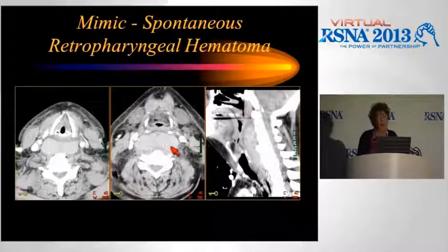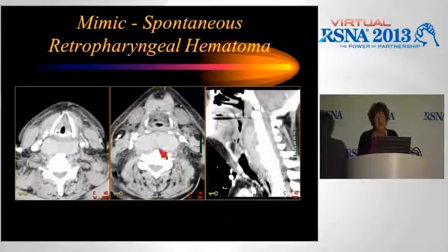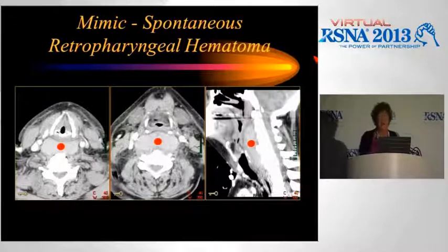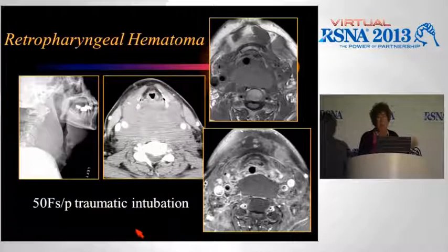Now, I don't know what the cause of this one was, but it's clearly visible here on CT, and I'm thinking it might have been related to the significant anterior osteophytes of the cervical spine. I don't know for sure, but I know for sure what caused this one. This was an oops, and you don't like oopses in medicine, and this was a failed intubation.